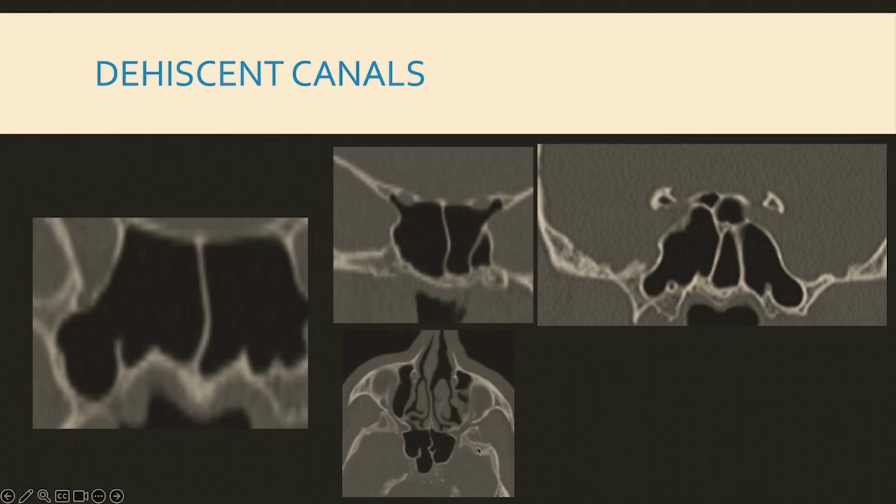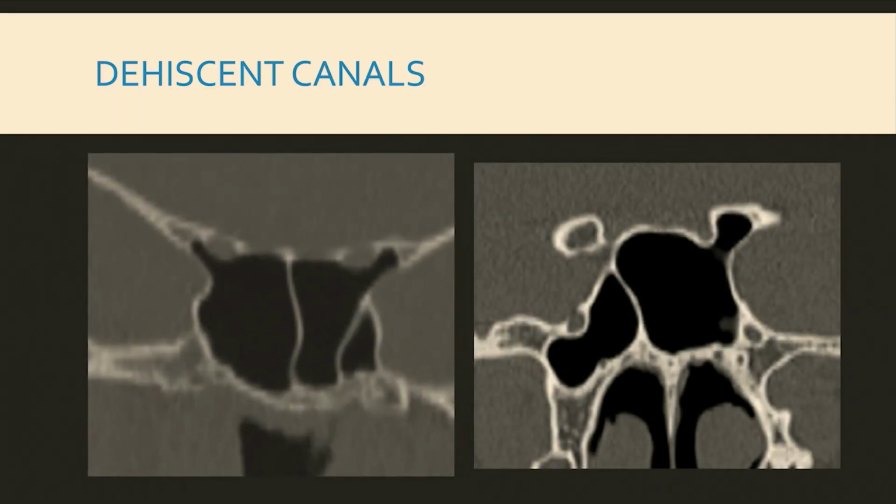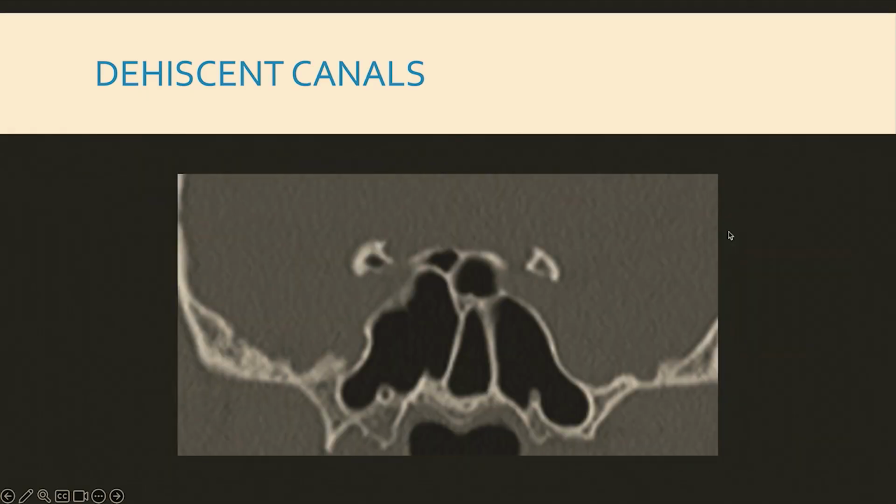Again, Onodi cells. The other thing you want to dictate, guys, you see the septation that goes right into the carotid canal. You want to mention that because if they take this septation down, that can dissect the carotid. So you want to watch that. That's a blown up version there. Just look for these crazy areas of pneumatization. This is the optic strut, an anterior clinoid that's pneumatized. And look at the Vidian nerve kind of hanging out in the breeze here.